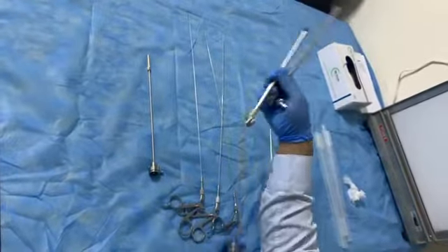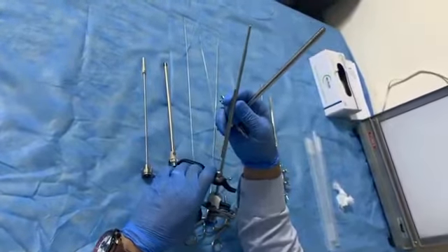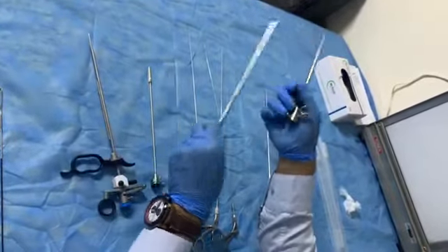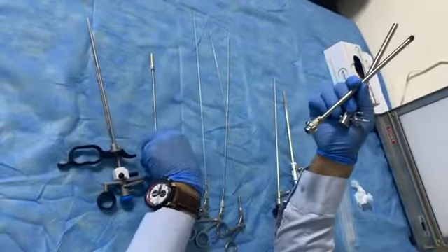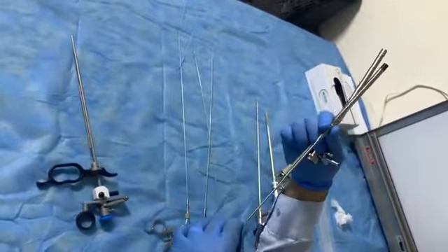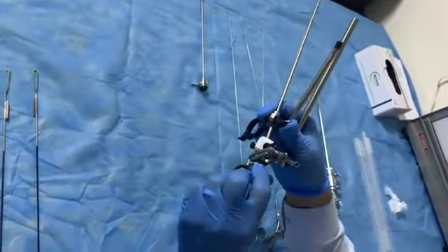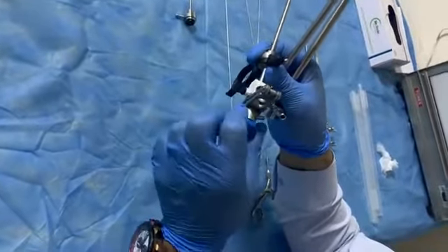This working part has two types, passive or active. This is the inner sheath and this is the outer sheath. This is the dilator. It is not important. When we want to push immediately, we need to use the dilator. And also here there is a guide. Also there are parallel lines, each one parallel to the other to be fixed. Otherwise it will release.